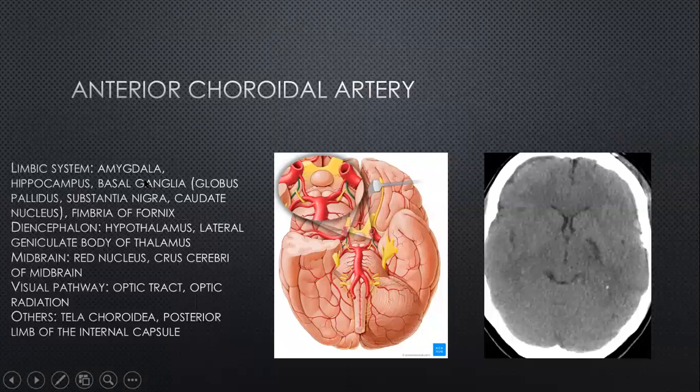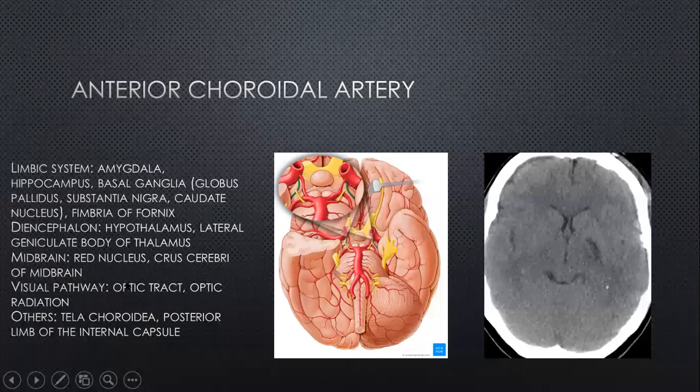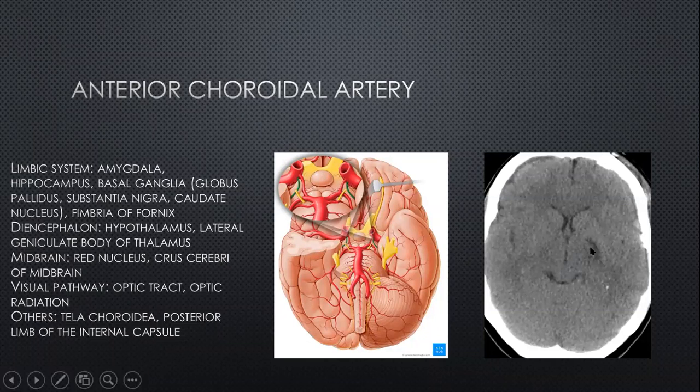It's a very important artery. It supplies very many structures, and any tampering with this artery, this was post embolization. Unfortunately, this patient developed an infarct in the posterior limb of the internal capsule.